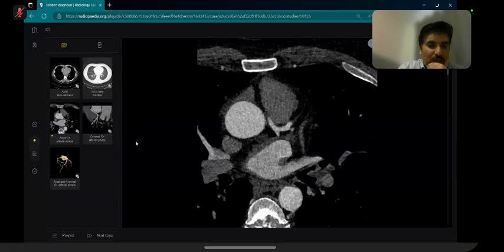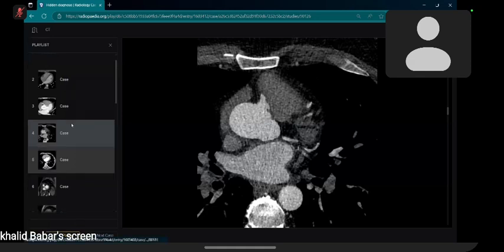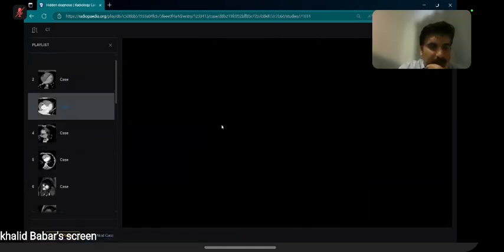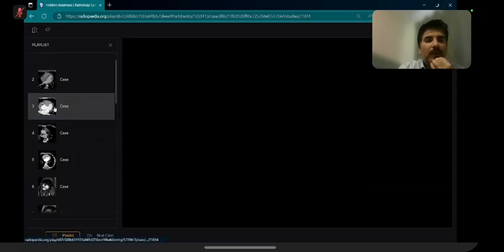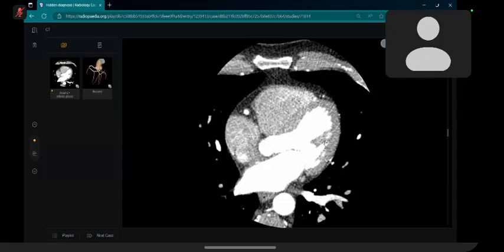Let me show you one more case, candidate one. Okay, sir. Candidate one, do you want to scroll? Yes, sir, I want to scroll. Sir, I have requested the remote control.